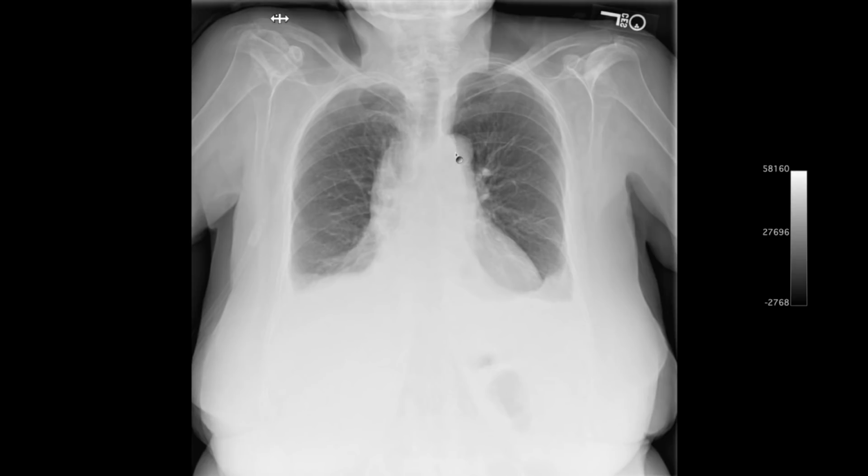And if this is the aortopulmonic pleural reflection, it's a good location for it. One could argue that perhaps the interface goes a little bit lower than is usually the case. But I think just looking at the frontal projection, everyone would agree that most of the time this abnormal interface relates to the so-called aortopulmonic pleural reflection and represents mediastinal abnormality.